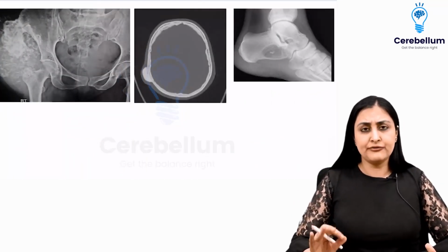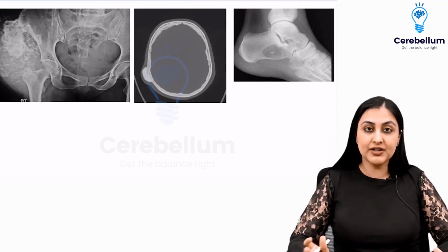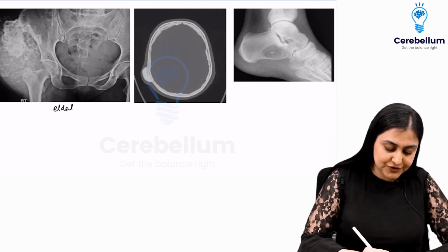Next, we want to just do a few spotters. Alright, so these are not very commonly asked, but I just want you to be oriented to the images here. So in the first one, you are having, let's say, an elderly person. I give you the history.